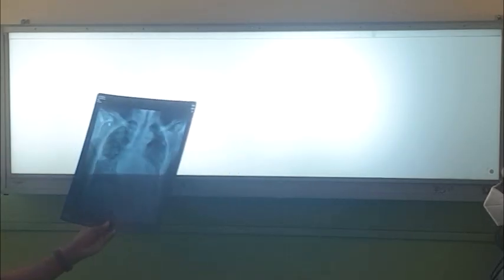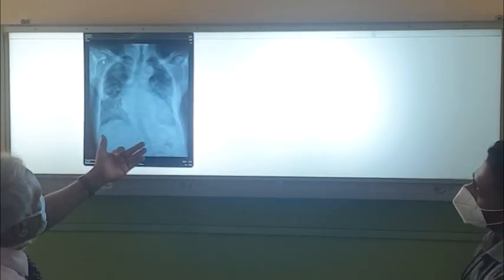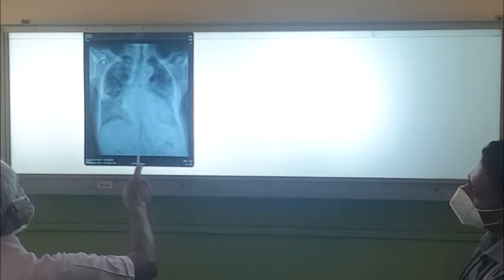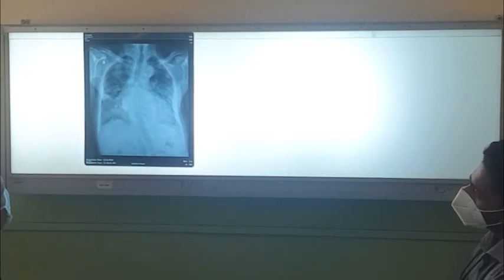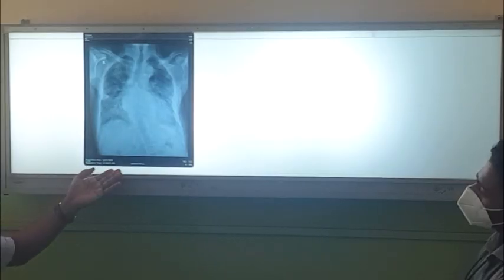And this is a poor quality X-ray, but one of our COPD patients who came with pulmonary edema. This is a big one, a bilateral pleural effusion, perihilar opacity, something there, right? Some people get upper lobe diversion. It's a poor quality X-ray. It's not a good example for pulmonary edema, right? The patient is fine.